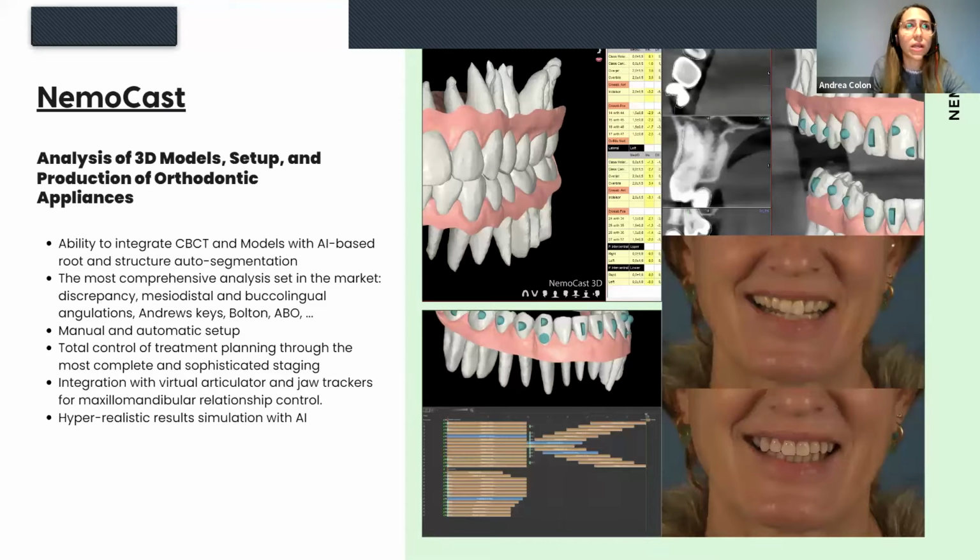And also you have the possibility to have the articulator. In the articulator, you could evaluate which ones are going to be your contacts. So you can do a full occlusal diagnosis on how this is going to look, which kind of contacts you are looking for, which is going to be the canine guide, or overjet, overbite. So you can also use it during your treatment plan.